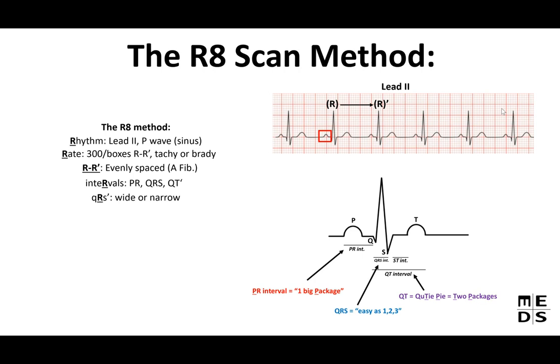And I'm going to have a video on EKG examples that's going to be coming up in a couple days. And that will actually go through these examples of wide and narrow QRS complexes. And then again, rise, where that arrow is over here, you want to see if you can see tombstones or ST elevations. Like I said, between the S and the T, at baseline, it'll be elevated and it'll look like a tombstone like this.